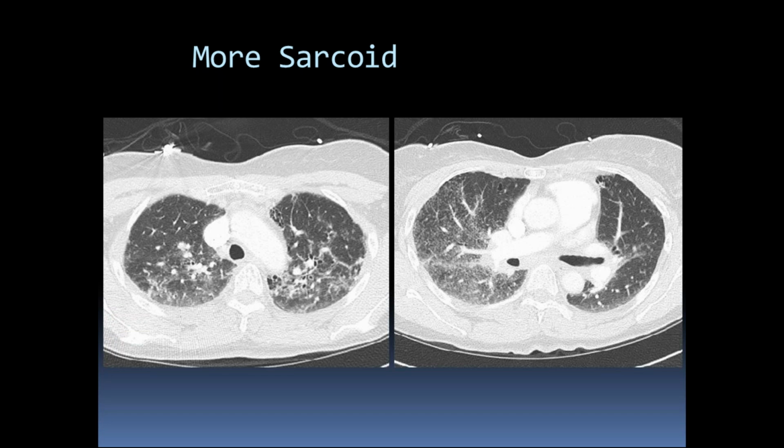So having some kind of clinical history, and some adenopathy, would really help you narrow down exactly what's going on, because trust me, I have my "oh my God" moments, and I have no idea what's going on. But when you buckle down and take a look at the individual findings, you can try to find areas of less involvement so you get a better idea of what's going on, and you can sort through all the findings.